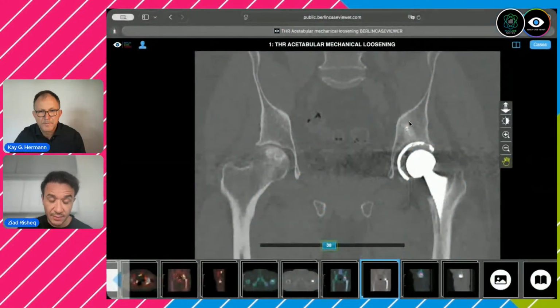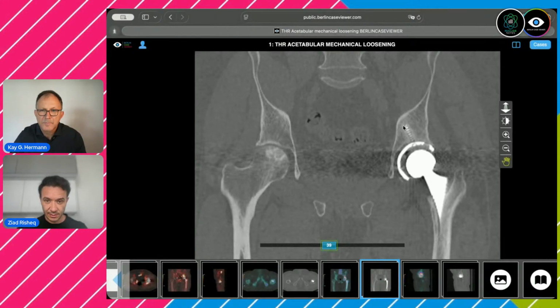So you would say that both screws need to be replaced because they have too much bone metabolism? Exactly. The screws, if you can see here, you have some kind of cystic lucency over here, even though it's less than 2 millimeter, but you have the cystic lucency. It's really obvious over here, and this is abnormal. So we don't usually see this lucency over the bone prosthesis interface.